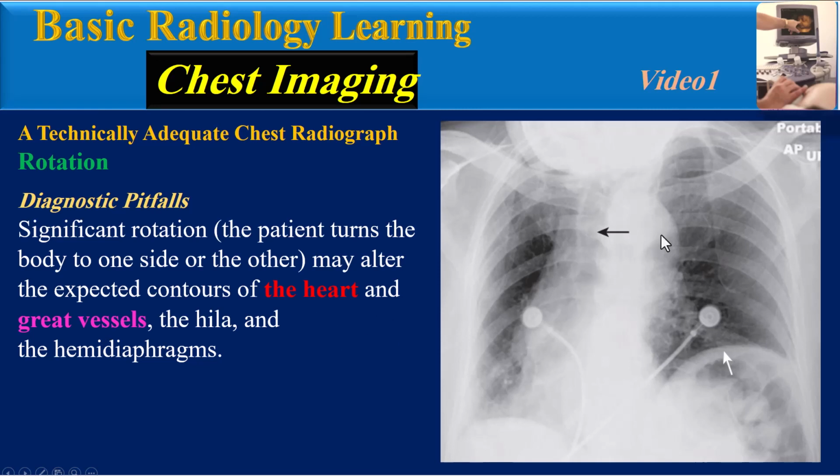This is a frontal chest radiograph of a patient markedly rotated toward his own right because the left clavicular head is much closer to the spinous process. Rotation can distort the appearance of normal contours of the heart and pulmonary hila. Notice how the left hemidiaphragm, being farther from the cassette than the right hemidiaphragm, appears higher than it normally would. The hilum could also appear larger than its actual size because of rotation. The heart and trachea appear displaced into the right hemithorax because of the rotation.